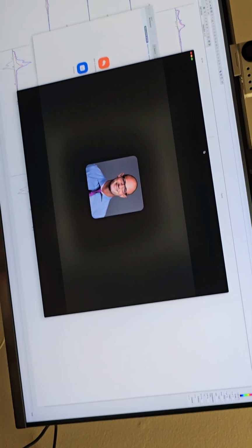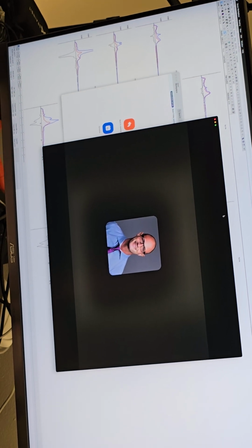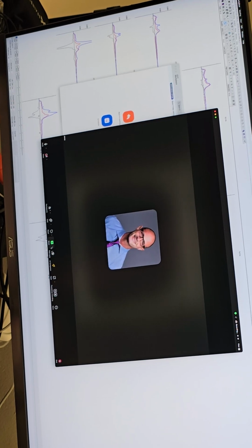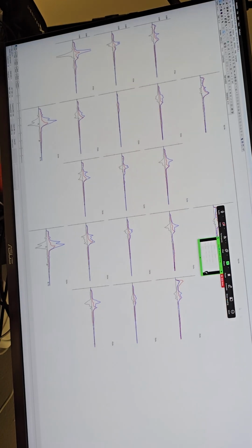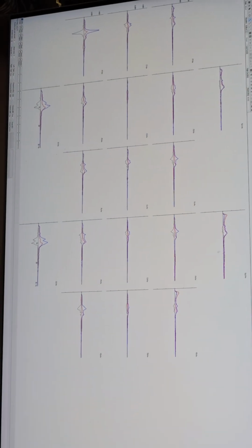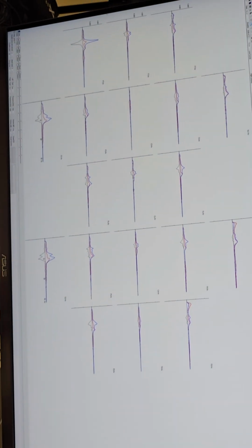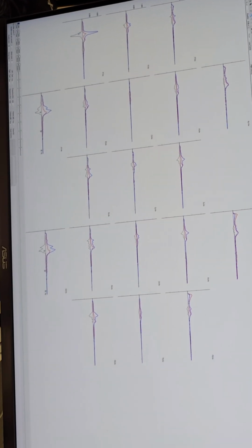All right, I'm here with Alex, and we're going to take a look at his midway EEG and ERP after 5 days, twice a day, one session of 13 to 15 hertz, and one session of the phase amplitude coupling to help working memory and other symptoms. Let's take a look. The first thing I've got here is just the power spectra, which we've looked at before. What we're looking at, from the top of the head, front of the head, back of the head, the blue is before, the red is after, and the gray is the change.